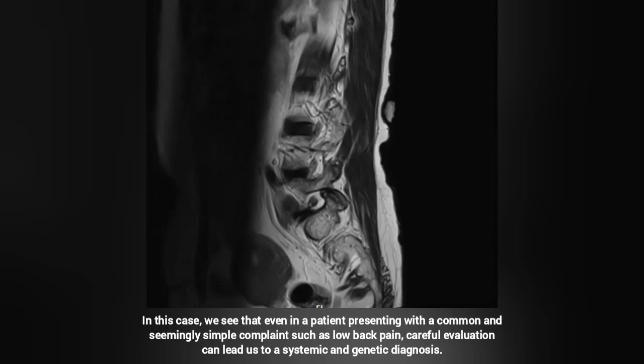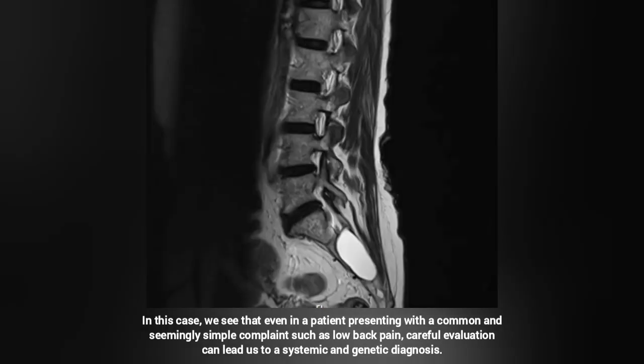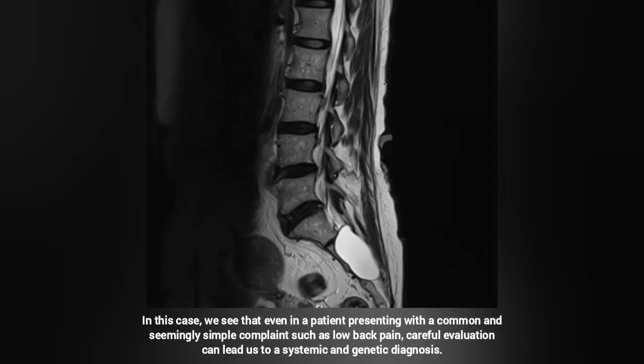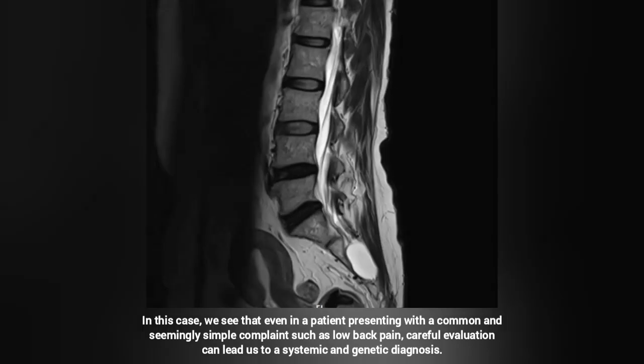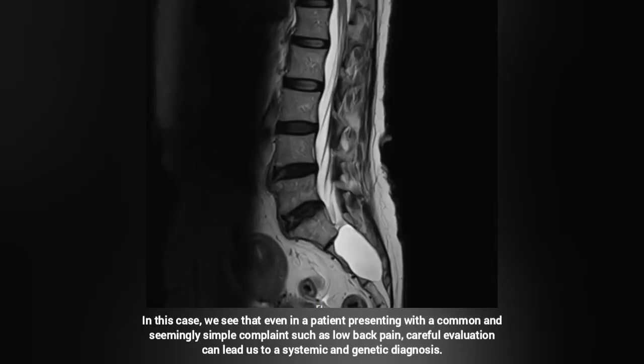At this stage, the picture I am considering is the following. A CSF isointense sacculation in the sacral region, approximately 5 centimeters in size, causing chronic remodeling of the bone. This appearance most strongly suggests an intrasacral meningocele or falls within the spectrum of Dural Ectasia.